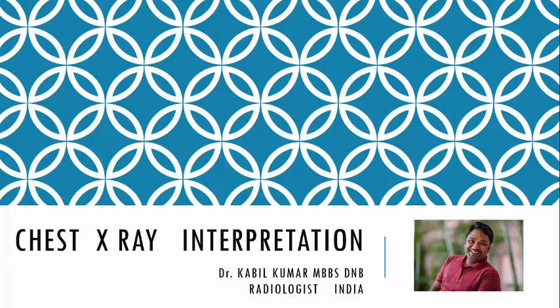Today I am just going to discuss how to approach a chest X-ray. Why is it so important? Only when you see chest X-ray details in a stepwise manner will you not miss some abnormal findings. Otherwise, if you just see it in a random way, you will tend to miss findings very frequently.